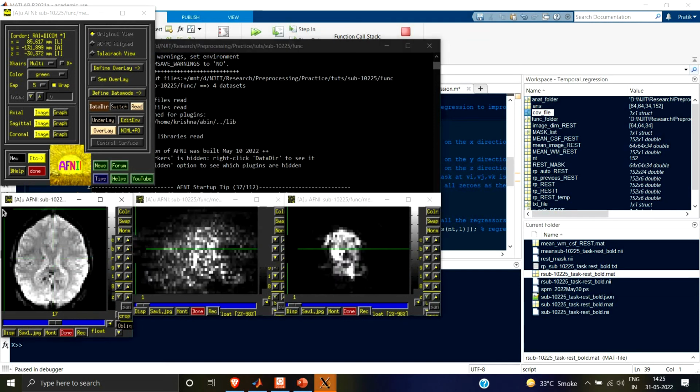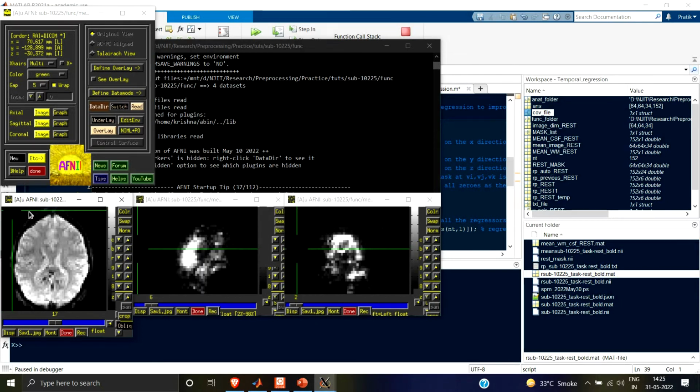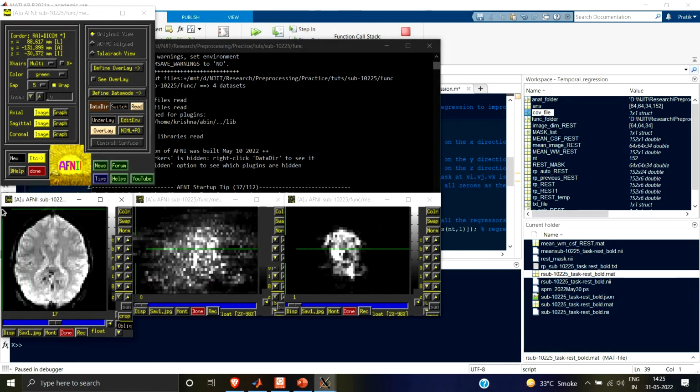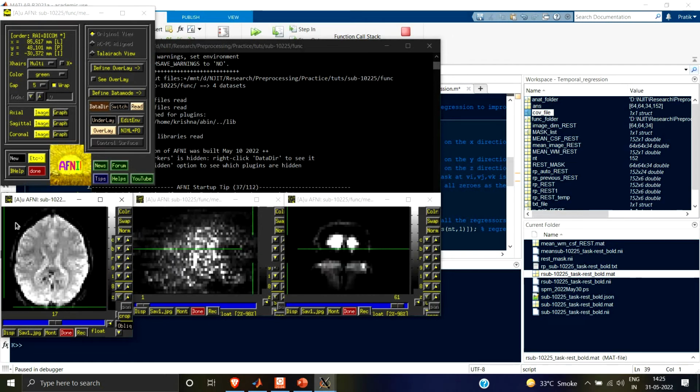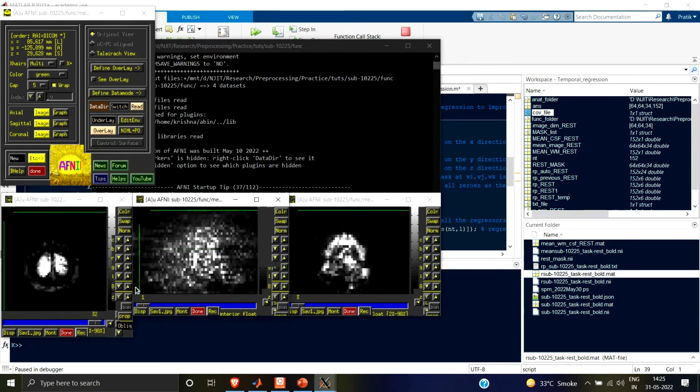Right. As I mentioned, first we will consider the top left voxel over here. Slowly we'll go in this direction, this direction. There will be a loop that will go from i equal to 1 to whatever the last voxel value is. This is the first for loop. Then the second for loop will go from here to here, and the third for loop will go in the z direction, say from here to here.